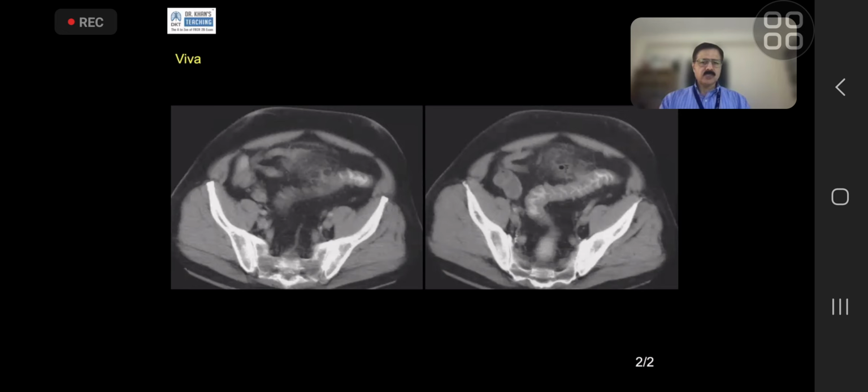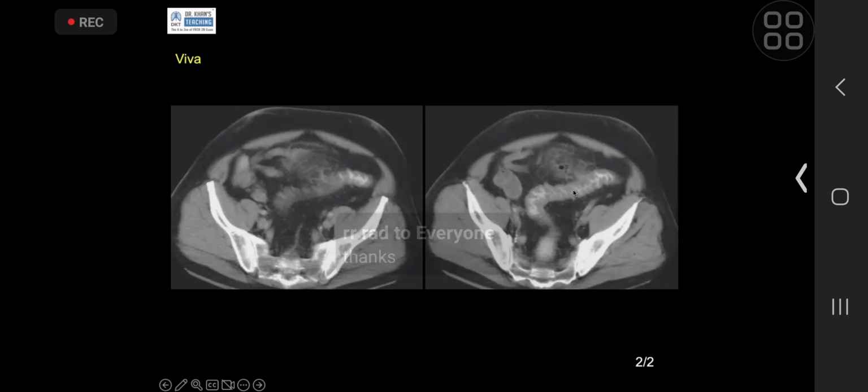From just a basic concept, first of all, diverticuli or diverticulosis is extremely common in the UK. It is so common that that is why diverticulitis presents so commonly. The basic pathology is that a diverticulum ruptures and causes inflammation in the adjacent area. The most common site is the sigmoid mesentery. So it will cause a bit of inflammation there. There can be air bubbles. So this is just diverticulitis, which is minimal diverticulitis.